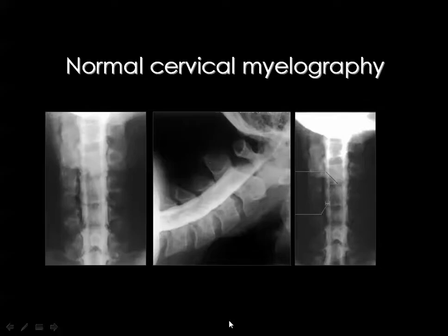In the cervical spine, we may have the frontal view and this lateral view, which is known as the cross table view or lateral view with horizontal beam, aiming at the delineation of the contrast column, which in this position will be dependent inside the spinal canal, lying on the posterior aspect of the vertebrae as well as disc spaces.